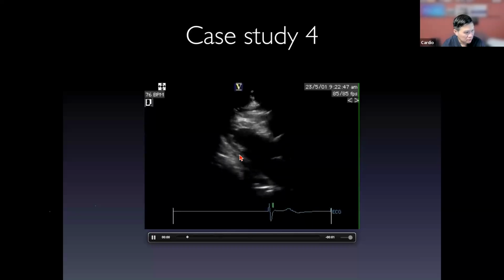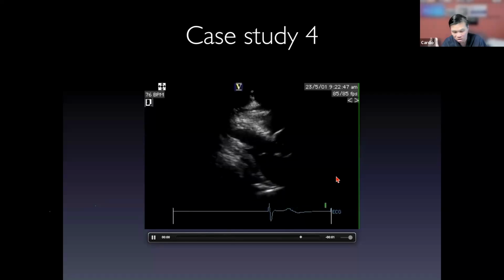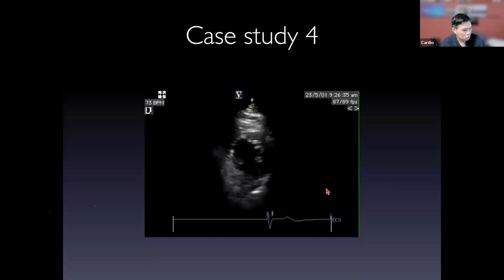When you look at the base, the mid, the apex, everything contracts. However, during diastole, there's a structure inferior, underneath the diaphragm, that causes the mid or proximal part to not go back to the flattened state. It actually gets popped up. As one of our colleagues in the audience said, this is called pseudo-dyskinesis. Again, going with the pseudo theme. This is the short axis.